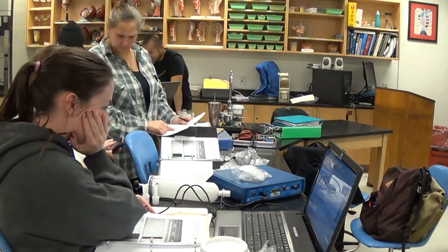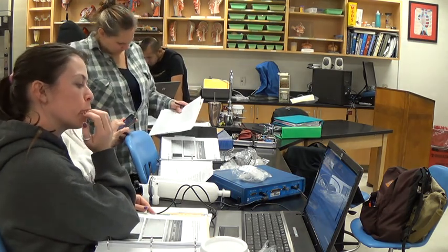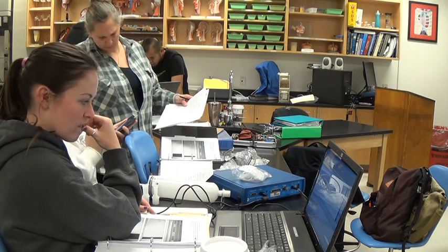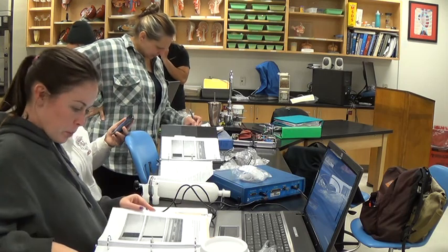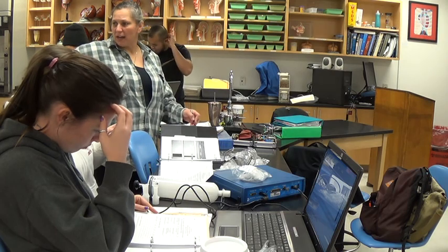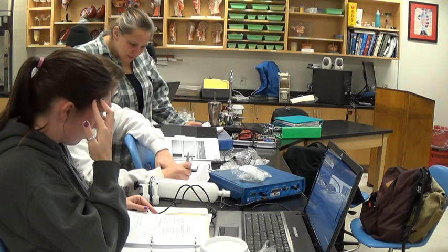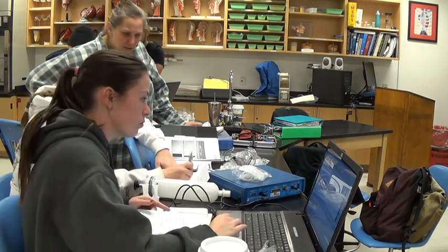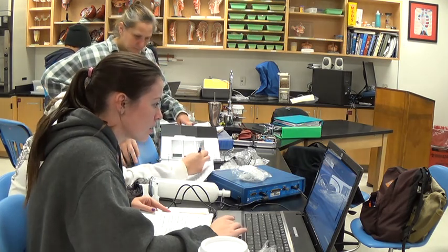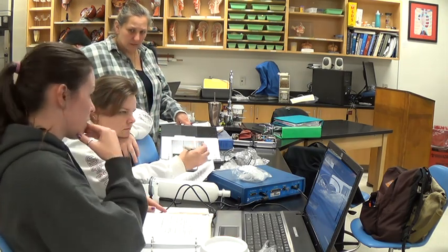All right, so I take it this is where you breathed in and breathed out. Okay, so expiratory volume is going to be this piece down here to approximately there. So we can start here and just approximate it. I'm going to go up here to approximately where I can draw a line across there, and that gives me 963 for our expiratory reserve. See what I'm doing? I'm measuring just that little bit that's below the exhalation.